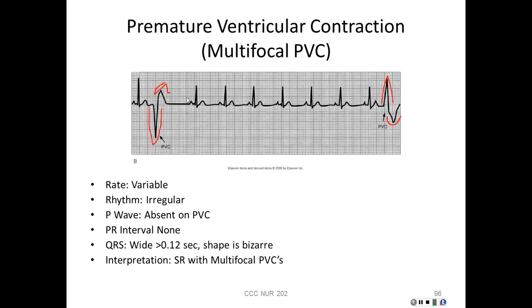I'm more concerned about this patient because these are coming from different areas. They're coming from different electrical foci within those ventricles. So there's more irritability in the ventricles, which makes it much more unstable for the patient. So I'm more concerned because I have these.